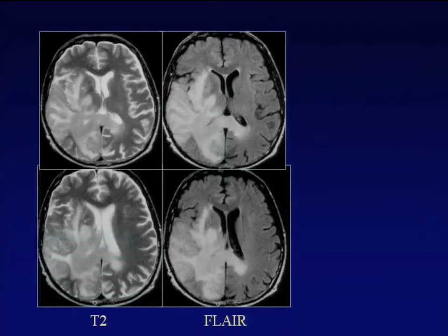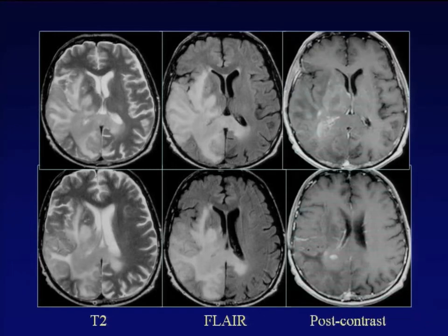And this is another very aggressive looking tumor. Very large tumor. You see the solid part, all this gray. On FLAIR and T2, this is the tumor and the edema. And somebody expects that post-contrast would show very extensive diffuse enhancement, and it's not the case here. You see only this minimal degree of enhancement. And this is, I believe, a take-home message. Dealing with intracranial primary tumors, sometimes the degree of enhancement does not reflect the degree of malignancy. And this has an explanation.